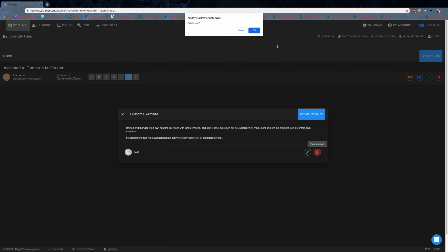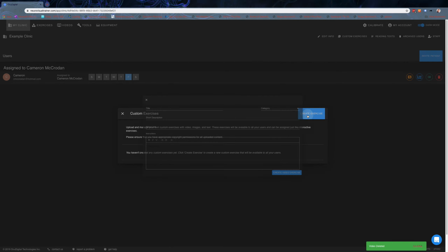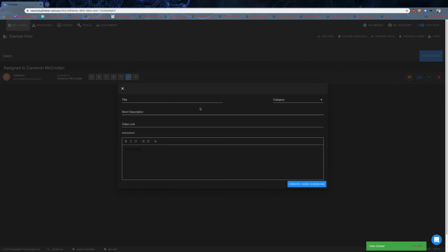We can delete that one if we don't want it, but we can create an exercise. When you're asked to create the exercise, you get to put in the title, you can assign it to a category, put in a short description and a video link.